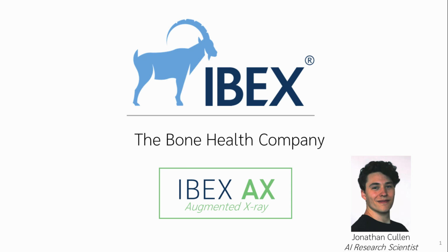IBEX AX combines unique elements of AI with classical image processing and advanced post-processing to deliver unlimited 2D radiographs from any 3D volumetric data with no additional dose, bridging the gap between CT and general radiography. This state-of-the-art software incorporates many advanced features. For example, IBEX AX uses AI to allow for the removal of objects such as casts and supports from the 2D radiographs it produces, providing clinicians with clearer anatomical viewing with the potential for easier surgical planning and faster diagnoses.